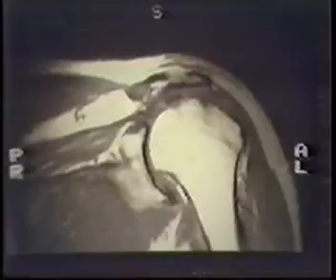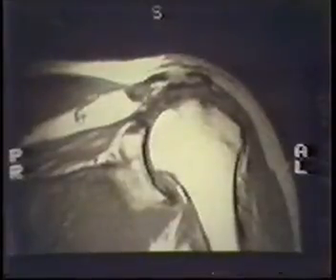Now, if that continues to progress, however, then you can get proximal retraction of the supraspinatus muscle, fatty degeneration. Notice how it's dipped down in an abnormal position here. The musculotendinous junction is way over here, not at the 12 o'clock position, it's way over here, and this is a huge tear of the rotator cuff with proximal retraction of the supraspinatus muscle.